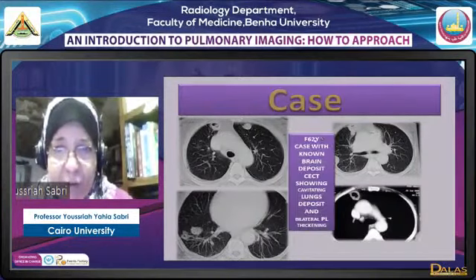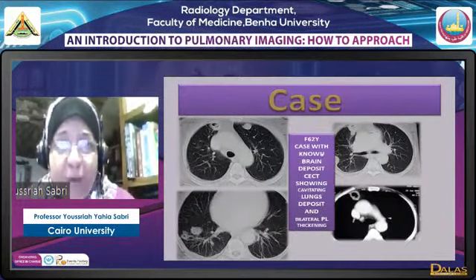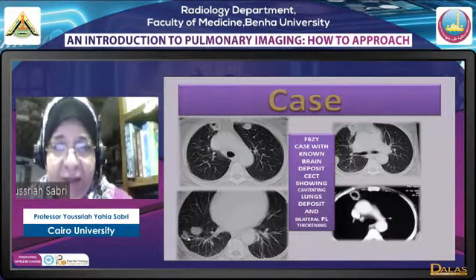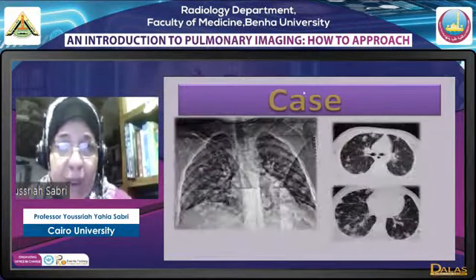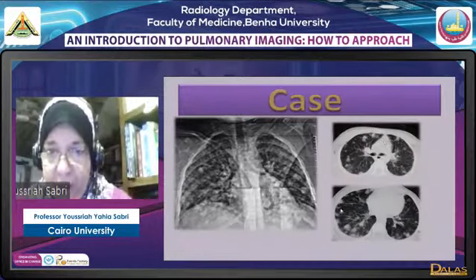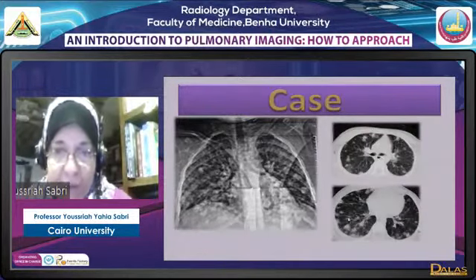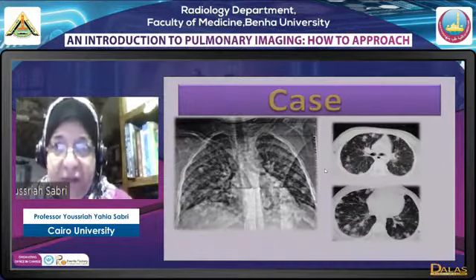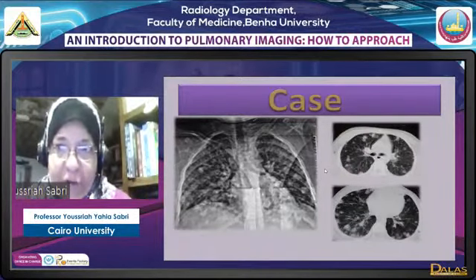Actually, in this case, it was a 62-year-old female with brain deposit. They were looking for the primary, chest CT was done and it didn't find a primary, but found metastasis with cavitation, as you see. Now here we have numerous, not countable, bilateral nodules and some of them showing cavitation and showing the angiocentric sign. Here we have the possibility of metastasis versus an inflammatory or infectious process.